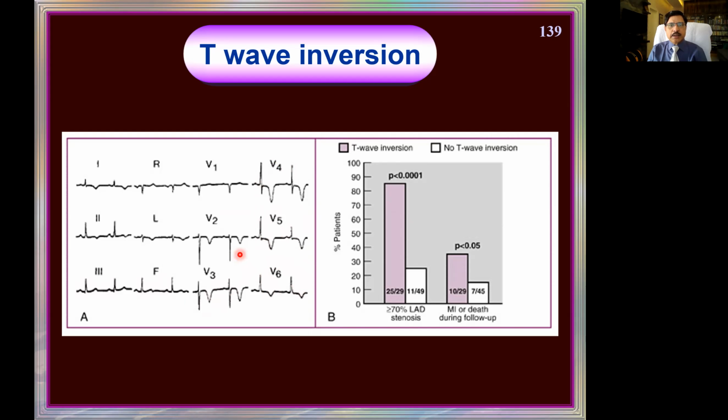So there is a T inversion in the anterior and lateral leads, as can be seen in L1, in AVL, in V5 and V6, and V4, V3 also show the anterior leads. These are called symmetric T inversions. Symmetric cup-shaped deep T inversions. Okay? Symmetric cup-shaped deep T inversions are a sign of old ischemia, old infarction. They can be there with the old infarction.